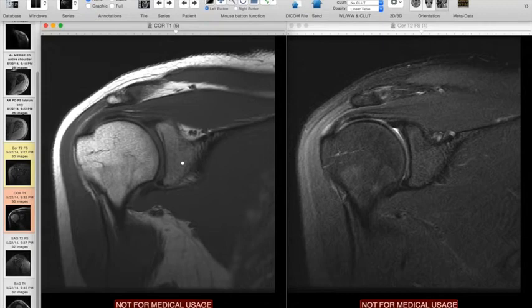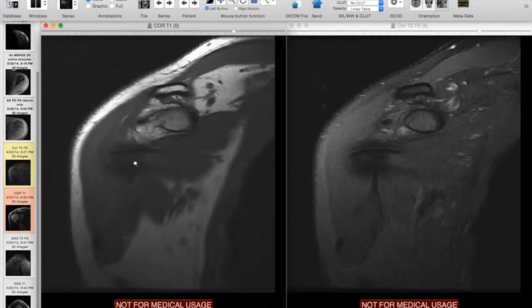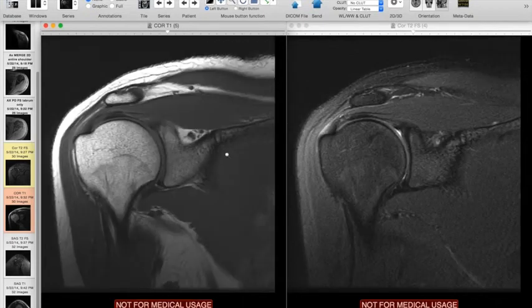It's definitely a good idea to look at the subscapularis on the coronals as well. And if the patient's nicely externally rotated, you can see the subscap coming across underneath the coracoid here, broad base tendon with multiple slips involved coming out towards the lesser tuberosity of the humerus.